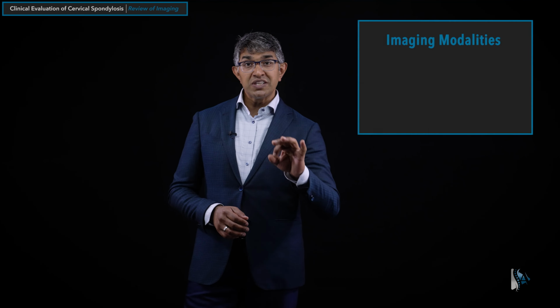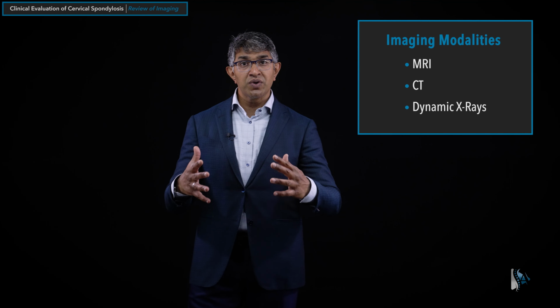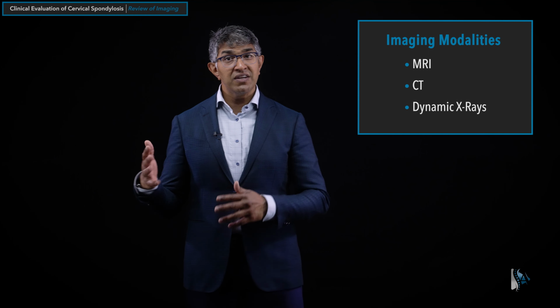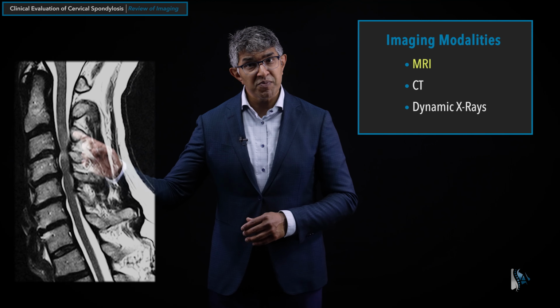And I usually won't go into a room having evaluated the imaging first, but rather evaluate the imaging once I have a sense of what's happening with the patient. So Chapter 2 really discusses cervical spine imaging in much greater detail if you're unfamiliar with it, and I'd encourage you to watch that if any of this seems unfamiliar. But we'll bring up an image here of a cervical spine MRI.